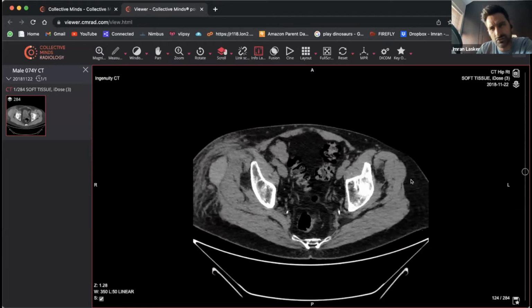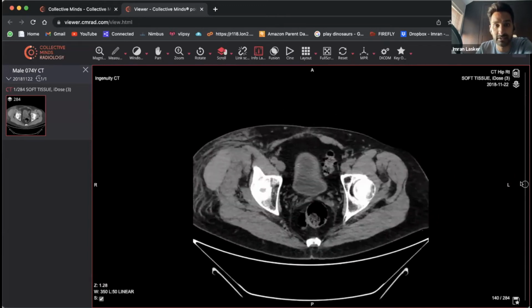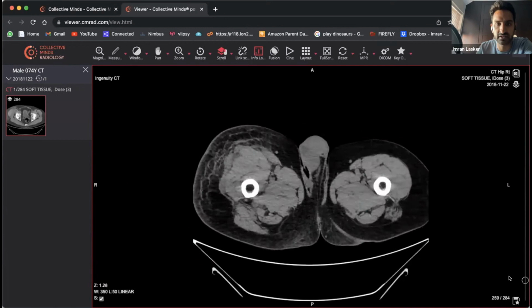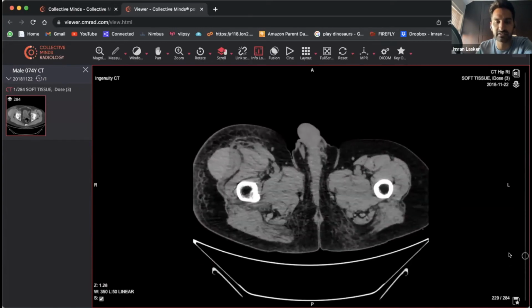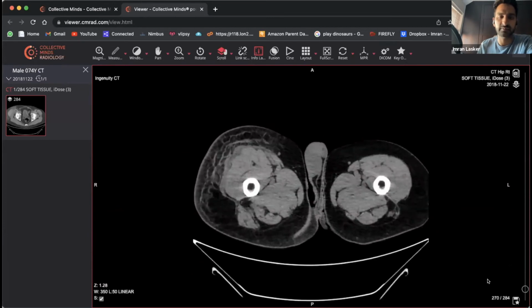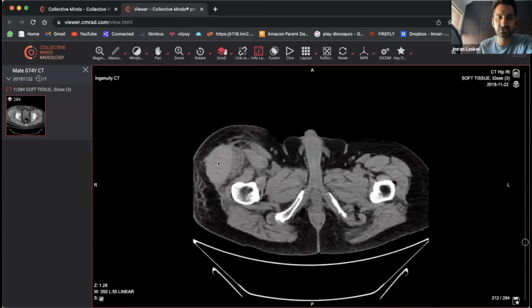Now, this is not the usual subcutaneous edema that you'd otherwise get with someone who's got heart failure, because this looks slightly denser than usual. And you can see there's a tiny little blob there, which you don't usually get with subcutaneous edema. And not just that, you've also got what looks like an elliptical, hyperdense region sitting within that area over there, just overlying the musculature. So that's probably overlying the TFL and the lateral thigh muscle. And you can see it kind of causes an indentation over there.